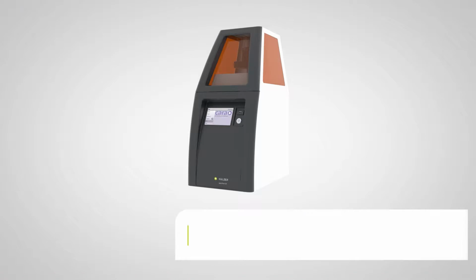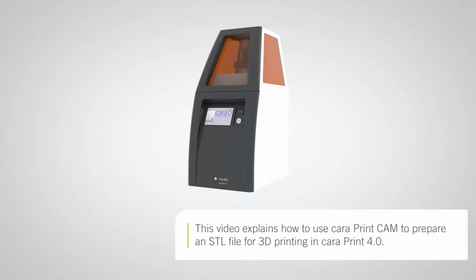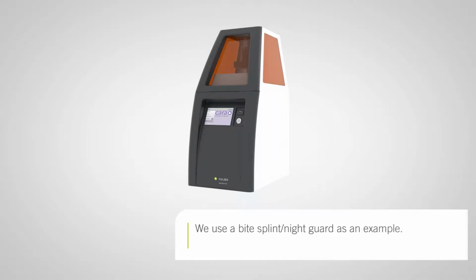In this video, we explain how to use Cara Print Cam to prepare an STL file for 3D printing in Cara Print 4.0. We will use a bite splint, also called a night guard, as our example for the video. It will be easier to follow the video if you do the same.